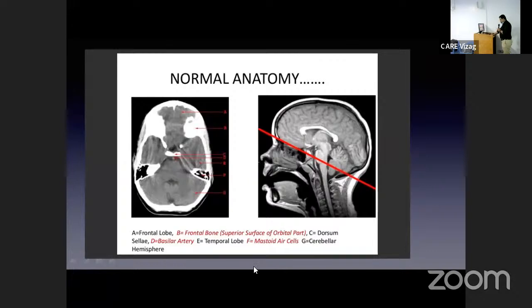Again, coming from posterior to anterior, you have the cerebellar hemispheres. Then midline, the vermis will be starting here. And now you'll be able to see the inferior most cuts of the fourth ventricle. So here also, this is the fourth ventricle, and you have the inferior projection of the fourth ventricle represented here. And now you see the pons.